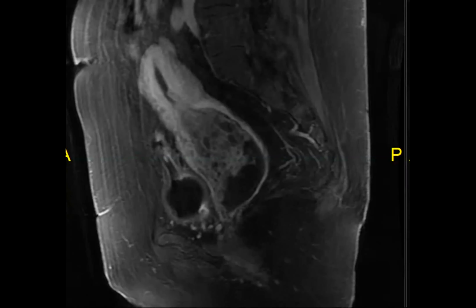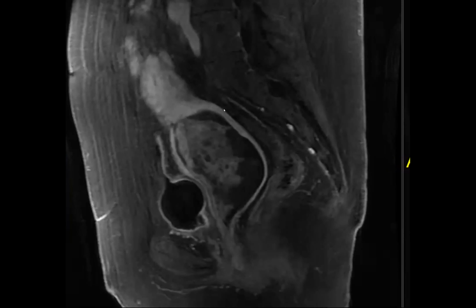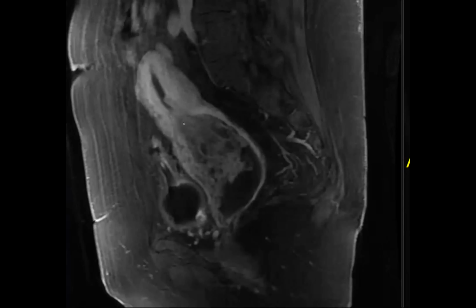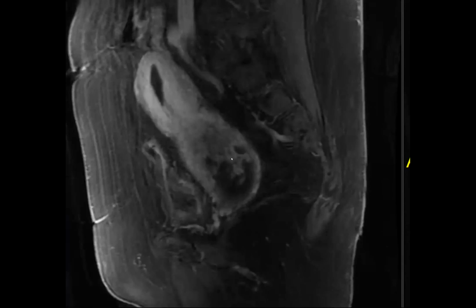I'm curious what people would have called this, leaning towards a polyp or something versus a malignancy. I'm still concerned about a malignancy. Well, I'll tell you what I read it as. I read it as this prolapsing polypoid mass with a large area of necrosis. You can see it arising from the posterior wall with a stalk.